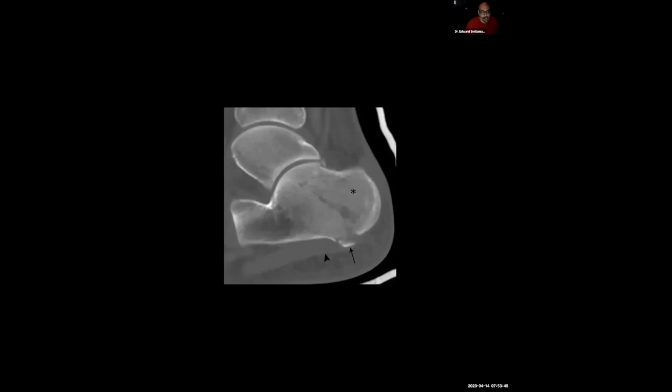With these tongue-type fractures, you can get involvement of the medial tubercle or medial process of the calcaneal tuberosity. Again, remember, that's the site of origin of the medial or central cord of the plantar aponeurosis, and that plantar fascia is an important structure that maintains the longitudinal arch of the foot. So it's important to look for these associated fractures with tongue-type fractures, this posterior medial essentially avulsion fracture with involvement of the origin of the plantar fascia.